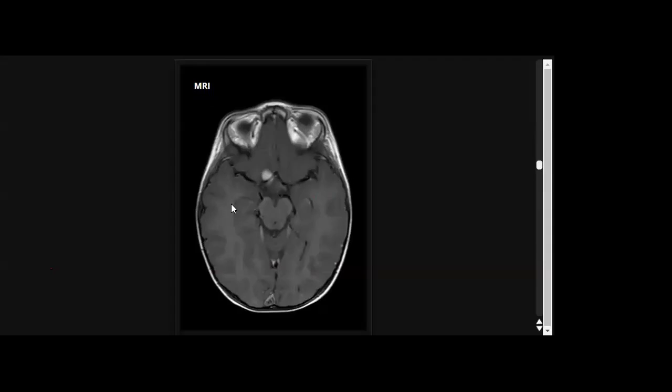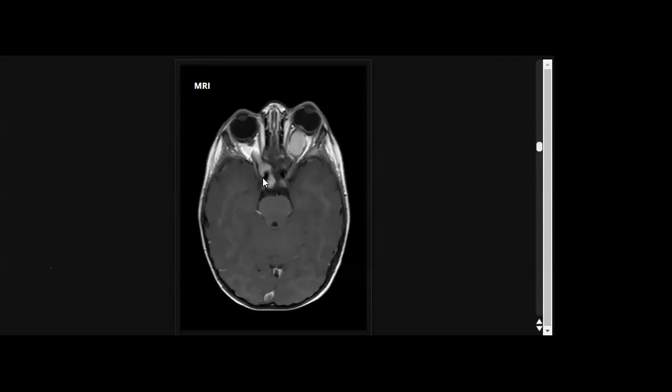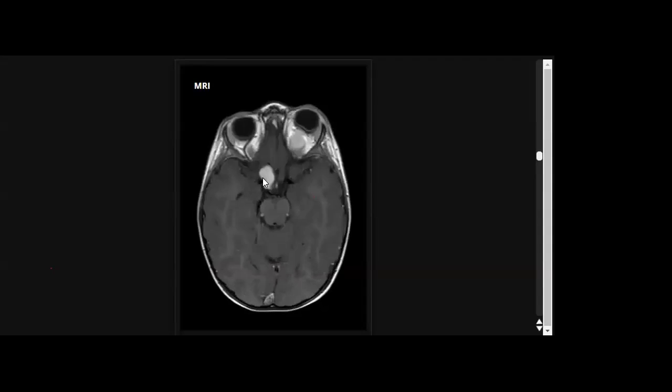Okay. So again, suprasellar lesions with enhancement may be extension from macroadenoma. The epicenter of the lesion usually is in the sella itself. Maybe craniopharyngioma. Craniopharyngioma may be totally enhancing. Yes or no? Papillary type. Excellent.